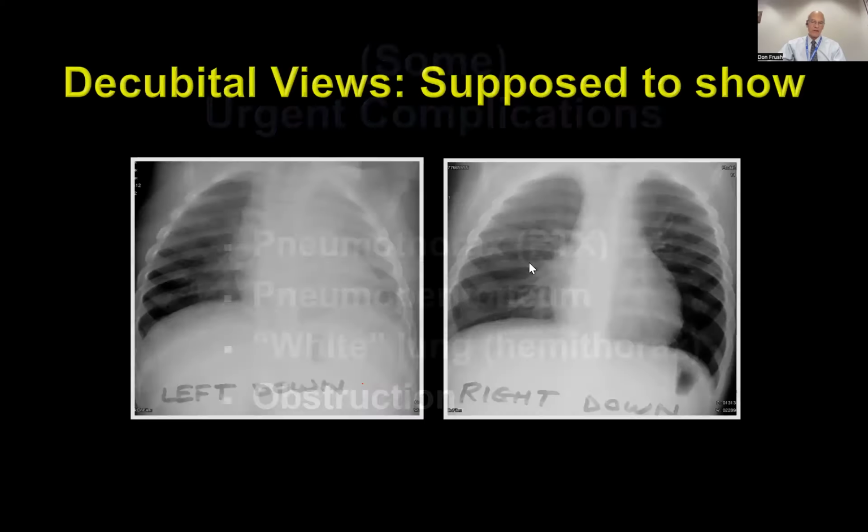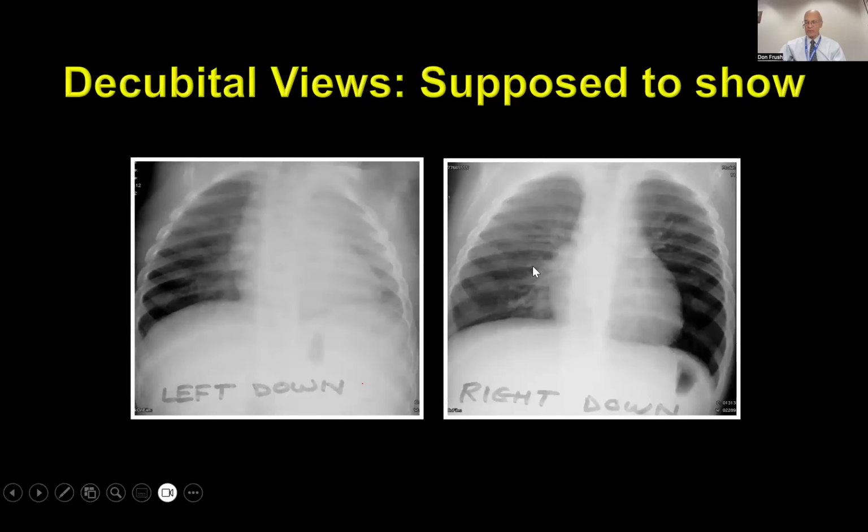Now, in the following 5 minutes, we'll deal a little bit with some obstructive things, including foreign bodies. So when children aspirate things, obviously, if it's a metallic item, a pin or something, you can see it, but oftentimes it's food, something you can't see radiographically. So you have to decide, well, is there aspiration or not?